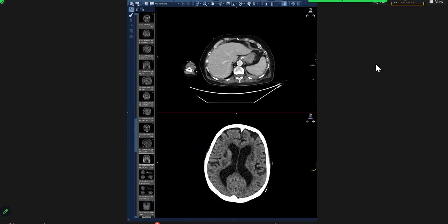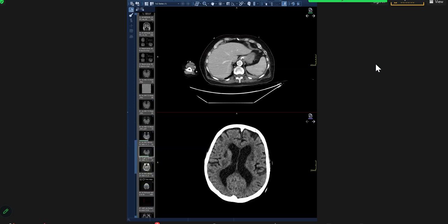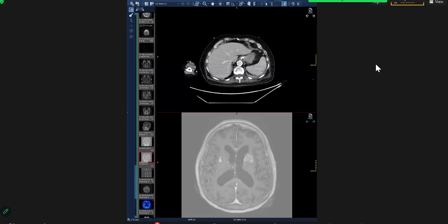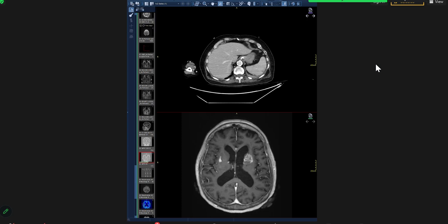Sorry, it has too many studies. Again, somebody really tampered with the window of that. So then what is this? These could be subacute infarcts because they also show enhancement. Exactly. So now you see that there are multiple infarcts.